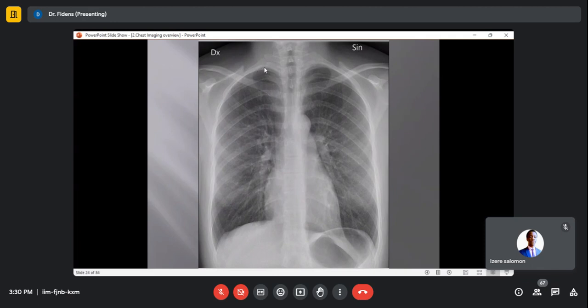Because the first 2 or 3 ribs are supposed to be counted, I start with the anterior aspect. Okay. The rest is simple. 3, 4, 5, 6, 7, 8, 9, 10.